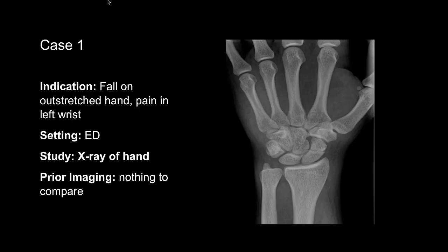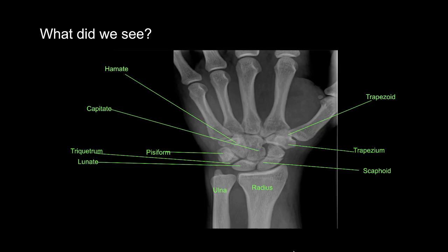And I'll just give you a second to look at it. Pause the video. And we'll dive into the anatomy a bit. All right, so the carpal bones. I know it's a bit complicated, but we'll get into some methods to make it easier.